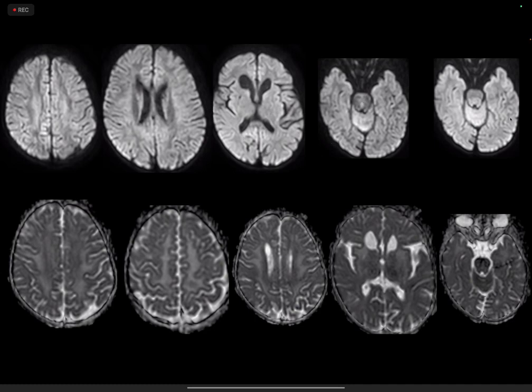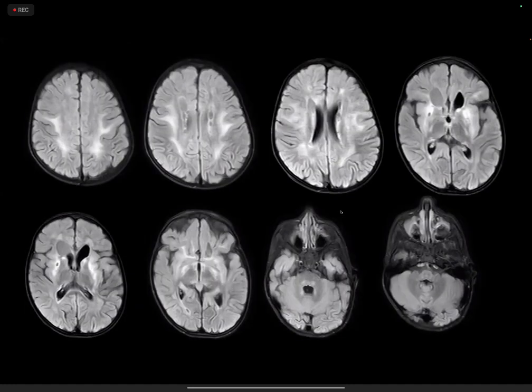Some diffusion changes in the brainstem structures, but the majority demonstrate associated diffusion changes, especially the white matter abnormalities. In the brainstem, I wasn't sure if it's true restricted diffusion, but you can see some degree of edematous changes in the brainstem and the thalamic regions. The FLAIR sequences better demonstrate the abnormalities, confluent abnormalities predominantly in the deep white matter, the frontoparietal regions extending also into the temporal lobes, basal ganglia abnormalities with atrophic changes and signal changes, cystic changes adjacent to the right frontal horn, reduced periventricular white matter volume, brainstem edematous changes, again more on the dorsal aspect.